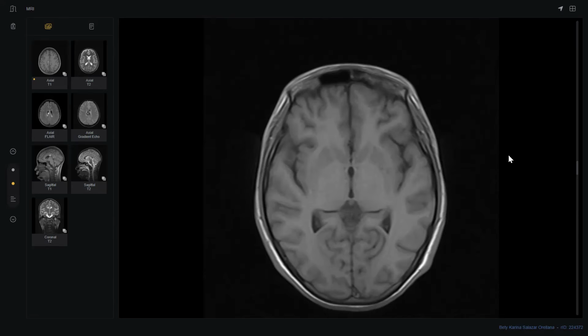Could you describe me the distribution? In fat embolism would be scattered areas in whole of the brain, giving the star field pattern. Yes, but very important. With diffuse axonal injury, it would be more confined to the gray-white matter junction, splenium of corpus callosum, and the brainstem. Yes, thank you so much. The distribution is very important. Besides the clinical picture, that in fat embolism, the patient has fracture, very important.